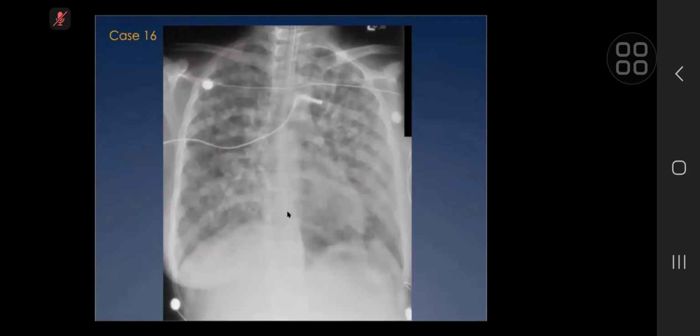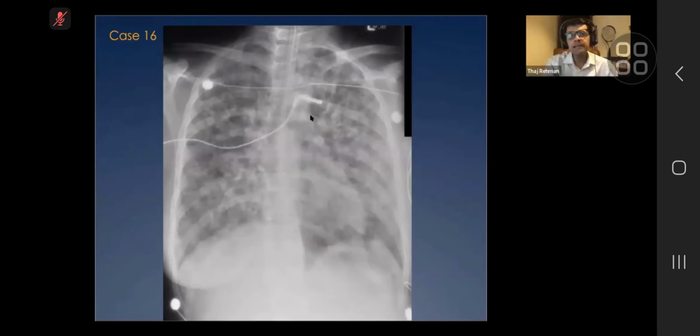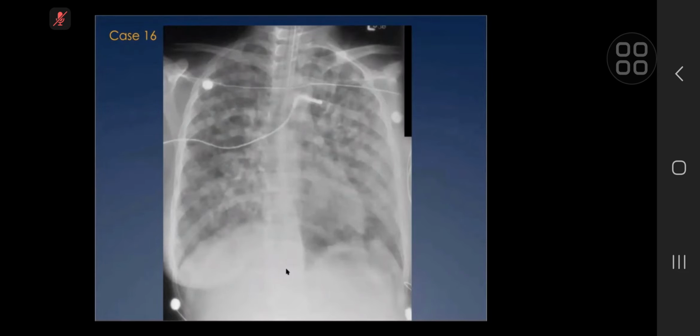Next. So it's a frontal chest radiograph. The patient has an endotracheal tube and some other line as well, which I can see is L-shaped. That's probably an ECG lead. It's not something significant. Okay. There are multiple bilateral rounded opacities or nodularity of various sizes throughout both lungs. They are larger than a miliary nodule, I would say.